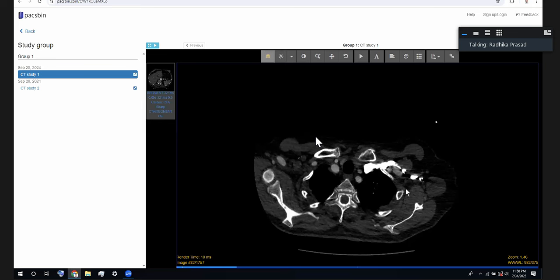So you'd say, I'm seeing this, it's an urgent finding. If the patient's still on the table, I'd get the radiographers to do a CTA, and I would get the clinicians on the phone and tell them I'm worried about acute aortic syndrome. So that's what you need to say. Have you got more images now?